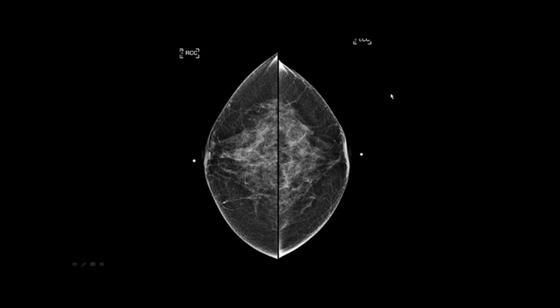Well, how did they know? They don't have any comparisons. This is the patient's baseline. So how does the radiologist know if the retroglandular fat isn't covered up by breast structures? How did they know this?